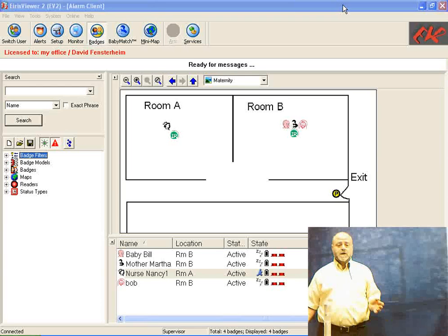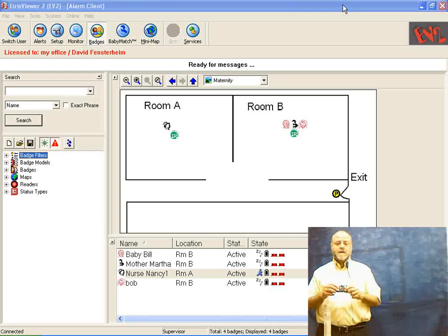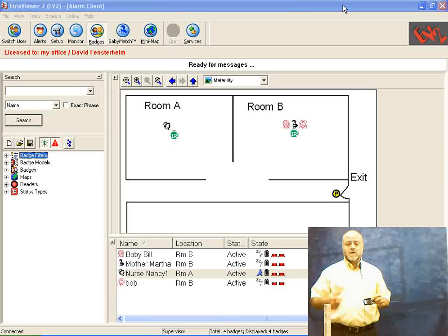Okay, so that's location. Now on the back I have, remember, buttons, and depending on the buttons I can also create rules saying what happens in the event that one of the buttons is pressed, and I get the location. I can define what happens on a button press of button 1 at certain locations. That might be something different from what happens in other locations.